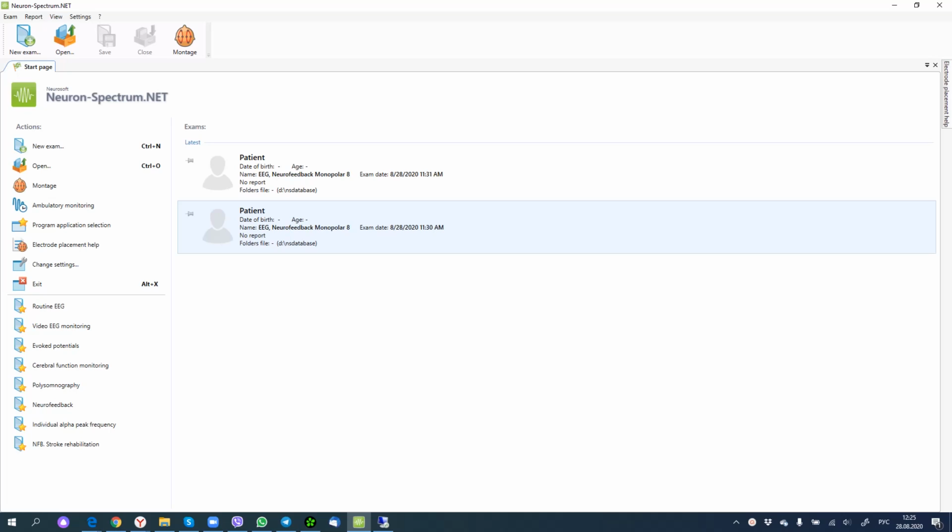In this video I'll show you how to perform neurofeedback training in neuronspectrum.net software. I start the software with default settings. On the left side of the start page you can see fast commands, for example, new examination, open existing examination, montage editor and so on.